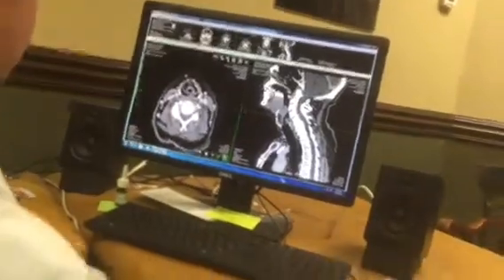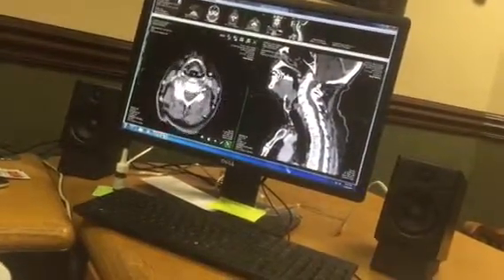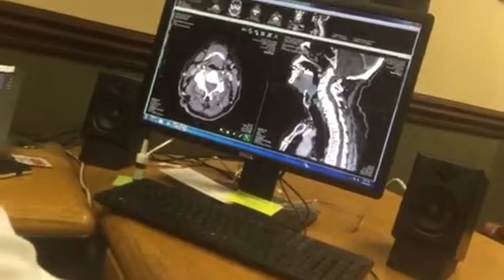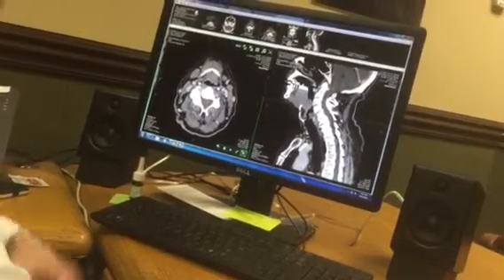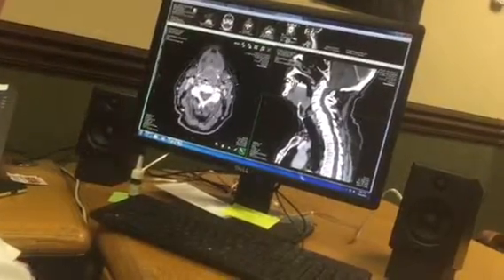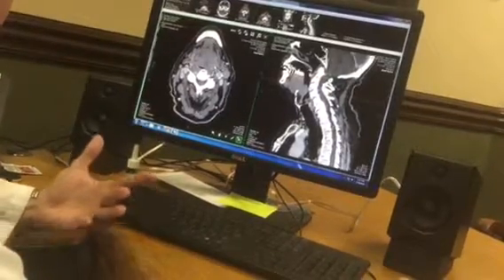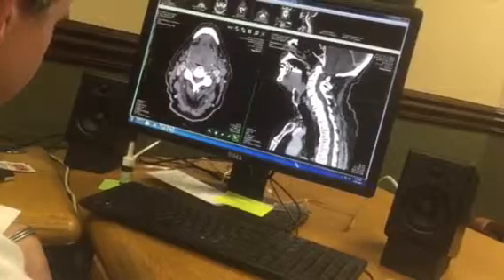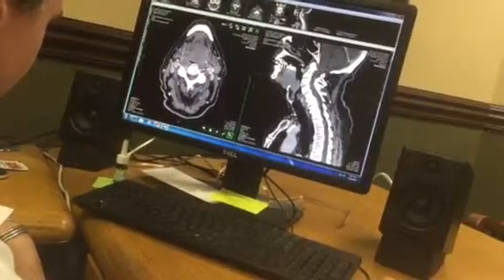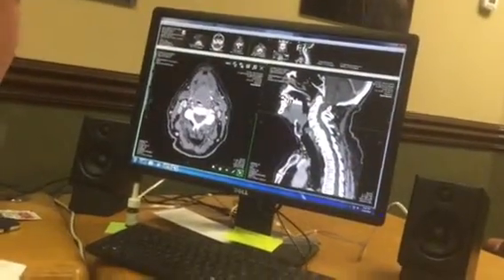I remember. And as you go down deeper, you don't see it. This is all normal. It's when you come up that you see it right at the epiglottis, right there. So it's into the vallecula, which is between the tongue and the larynx. And as you go up, you kind of lose it in here. This is very indistinct. The borders are somewhat indistinct. I think even the radiologist comments on that.